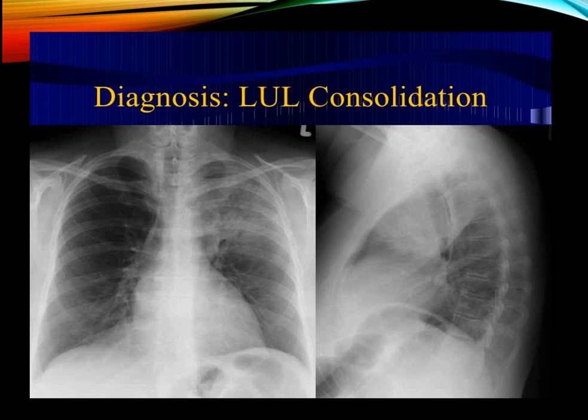The next step is localization of the lesion. From the PA X-ray you notice that the left cardiac border is clearly seen. So the lingula is not involved, because lesions in the lingula should obliterate the left cardiac border. Also you notice from the PA X-ray that the left dome of the diaphragm is very clear, so the lower lobe is not affected.